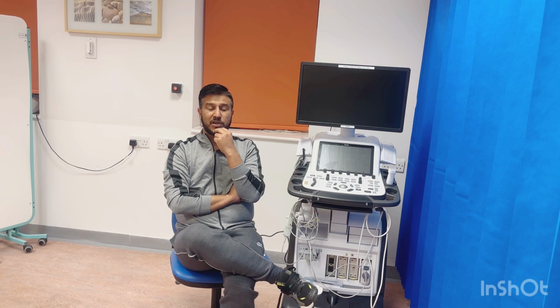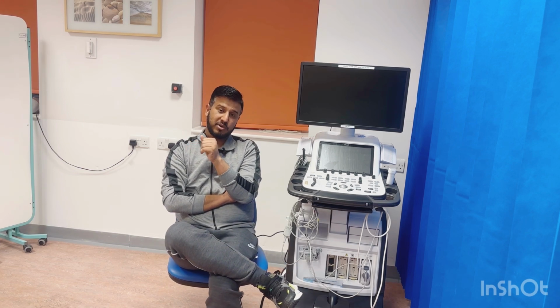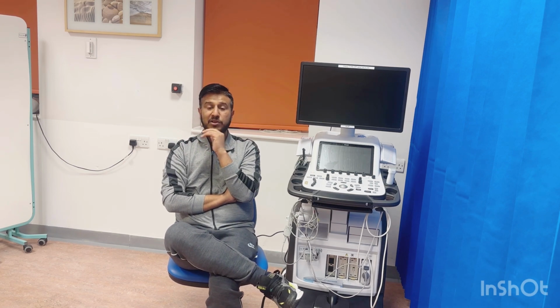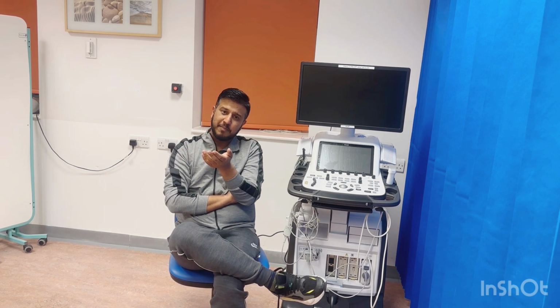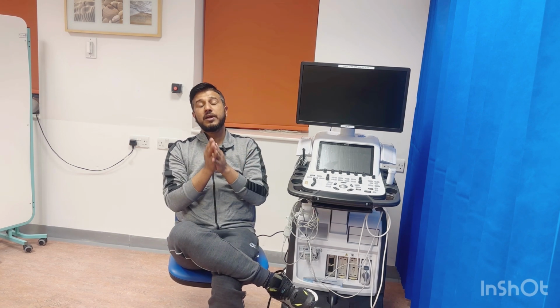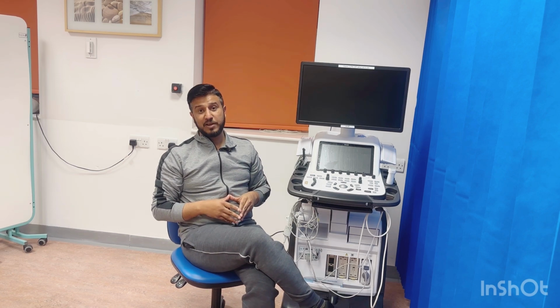They can also cause aortic root dilatation or aorta dilatation. Even in bicuspid aortic valve you can also have the dilatation. So these are the main reasons, but echo-wise we need to look at the dilatation, okay. So how we measure the aortic root, that is also very important.